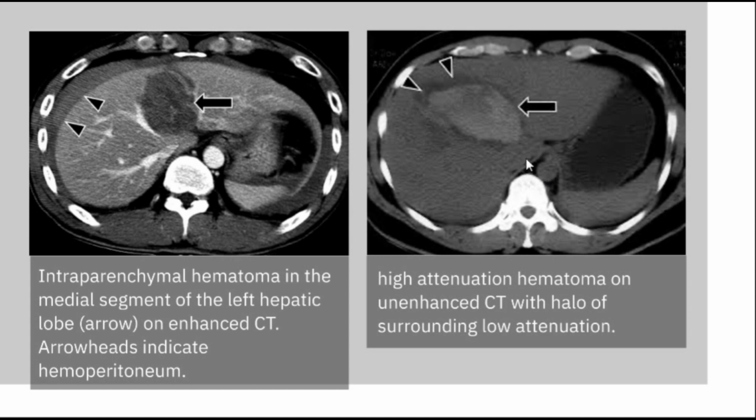Of course, we can see this in native CT scan. There is no contrast media inside the aorta. And in this other image, we can see a tree-like branching within the liver, which is the contrast-filled vasculature of the liver.